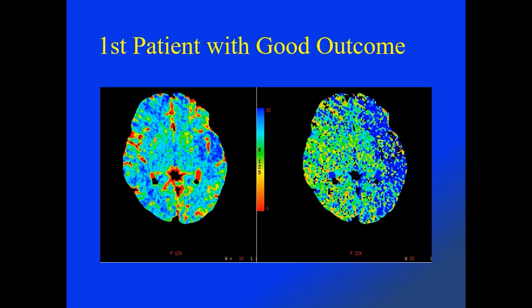The explanation behind the two different clinical outcomes of these two patients can be ascertained by the evaluation of the perfusion CT images.